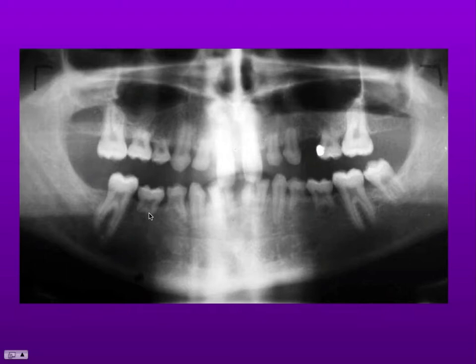It's produced by resorption, but with a little bit of healing of the bone leading to ankylosis of the root of the tooth. With the growth of the jaw, the consequence is that the deciduous tooth may start to sink down relatively compared with the surrounding bone and teeth. This can cause problems. You can almost get a reverse eruption developing and even pericoronal infections occurring.